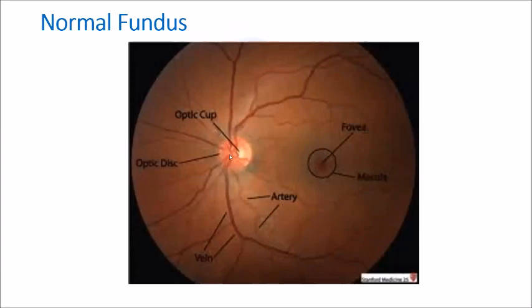This is the optic disc, and the vessels are coming from the center. Try to remember my words: the vessels are like spokes in a cycle tire. They radiate from a center, so vessels are actually radiating and converging towards the optic disc. This is one way of identifying the optic disc in practical fundoscopy. Why is this darker, Dr. Faryal? You say this is normal, but the previous one was not that dark. Possibly it is a negroid patient. Yes, got that.